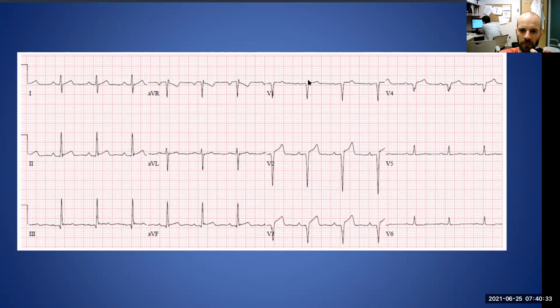But we have got big Q waves present in V1, V2, V3, V4. So this is most likely to be someone who's had a large myocardial infarction in the past. You can tell it's a big one because not only have they got very large Q waves, they've got no R waves at all. Their R waves have been completely replaced by Q waves. And they've got this scooped appearance, which is the sort of thing that you might find after a large myocardial infarction, where they have an aneurysmal segment in that place left behind.